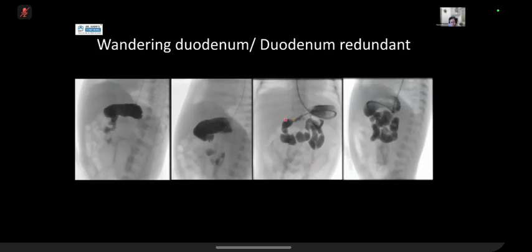So you can see that this one, this bit's usually the first part of the duodenum, first to second, is very redundant. You just wait a while and like, where does it go? And then finally it does a little loop before it goes up to your normal position. Some of you may wonder, is this volvulus? Is what's going on? As I said, we need two views.